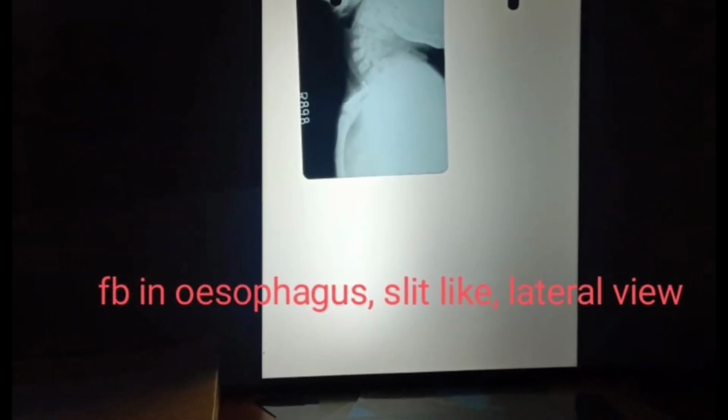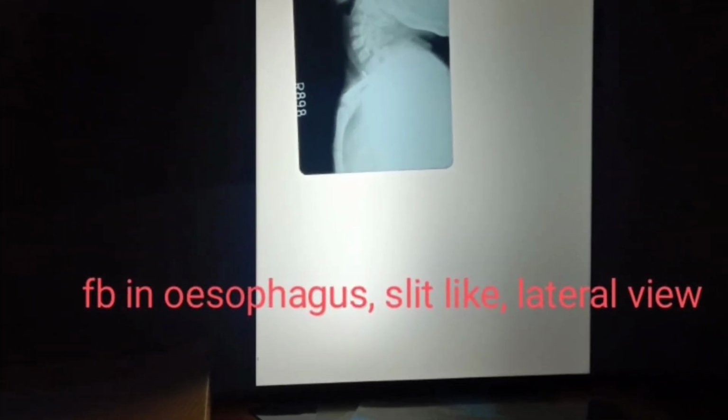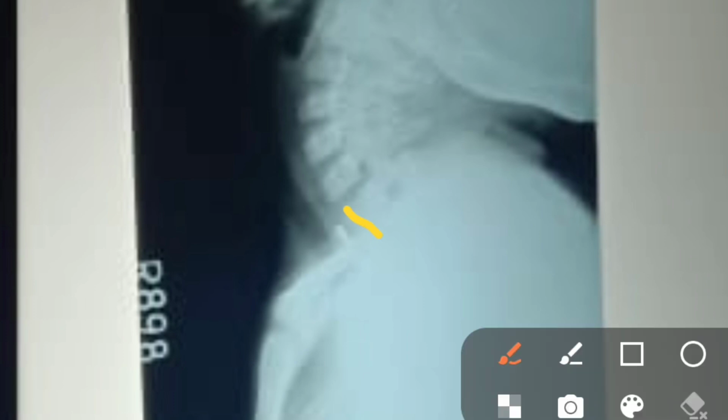Here you can see a foreign body in the esophagus, slit-like, in the lateral view. How do you identify whether the foreign body is in the esophagus or the trachea? If the foreign body is present just in front of the vertebra, then it is more likely to be present in the esophagus.